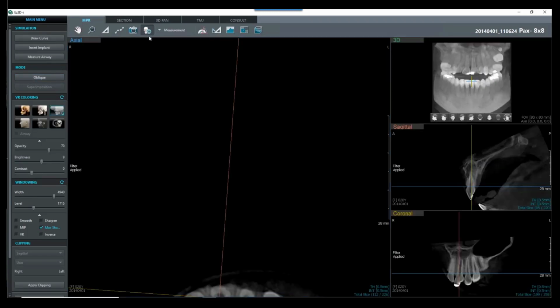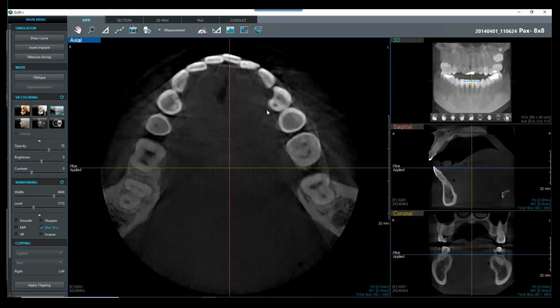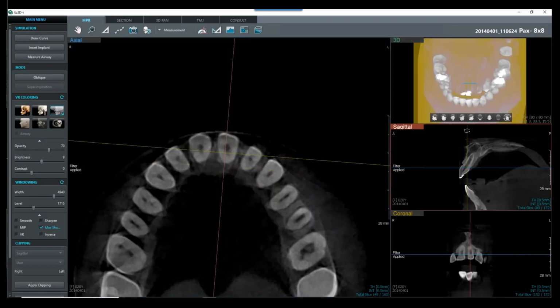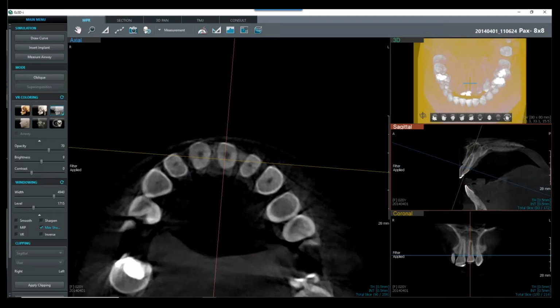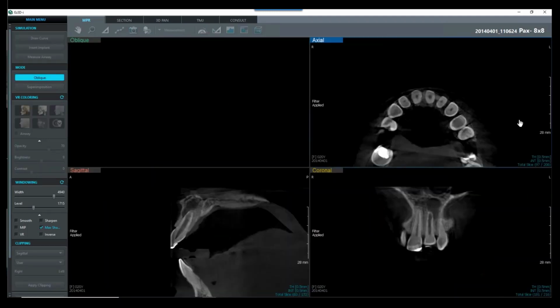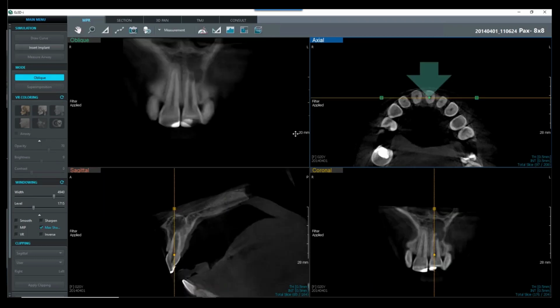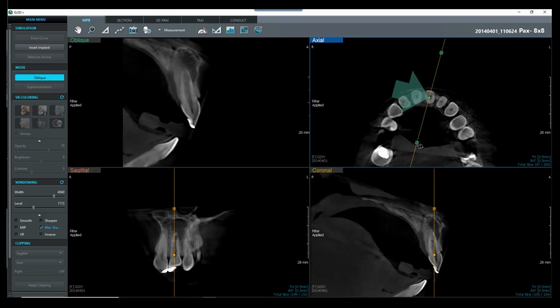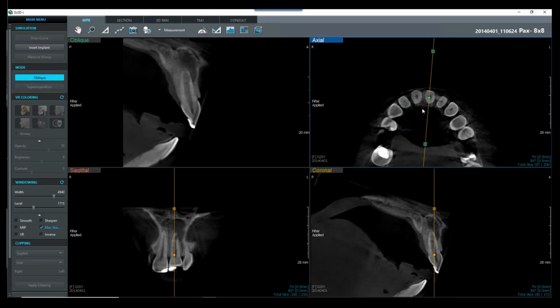area. But what we did is we had an implant placed, and we right-clicked on that implant. If I was doing this for a certain tooth, we could click back here for tooth number 9. We could go to the center there through that canal. We could rotate all of our lines to get through the long axis, and then click on oblique, and then in our axial window, click on that center point, and now we're rotating around that 360 degrees. If we already have the implant placed, we just right-click, and that's going to set that oblique, all of our axis points through the long axis of our implant there. So, perfect. Thanks.